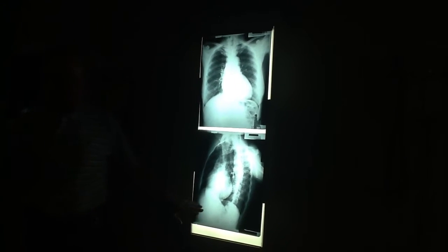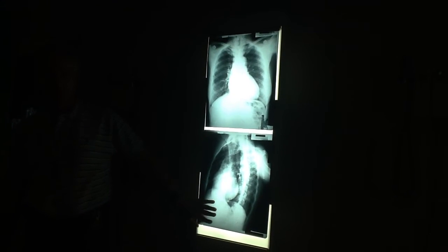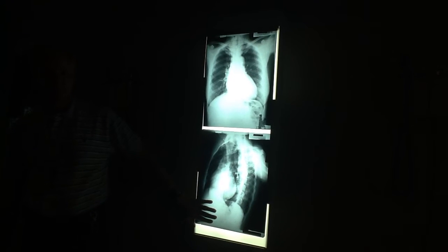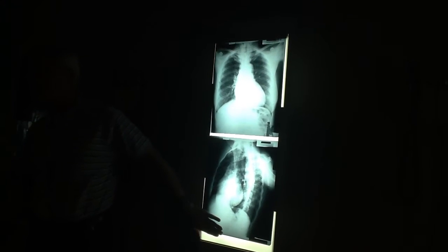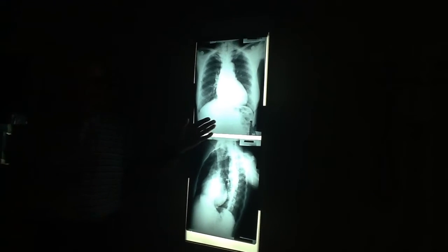Now, what view is this? Oblique. This is an oblique. And which one is it? Well, don't feel bad if you don't remember, because we haven't talked about the oblique view since last quarter. You don't see the arch of the aorta.